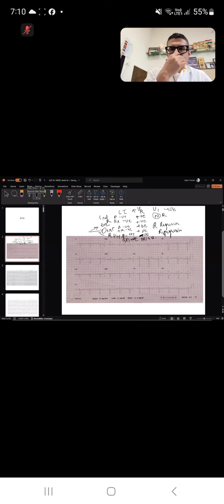So based on the P wave, QRS complex, and the R wave, you decide whether it is dextrocardia, whether it is lead reversal, or it is predominantly right-sided forces, whatever the cause, right ventricular hypertrophy or left-sided forces are less, whatever the cause, you differentiate these three causes, okay? So is it clear for everyone? Sir, you want to add anything here?